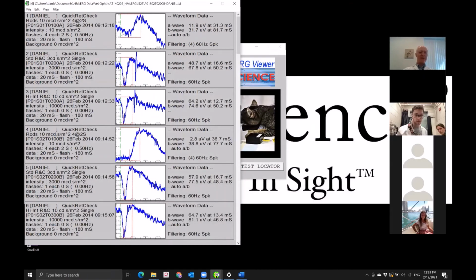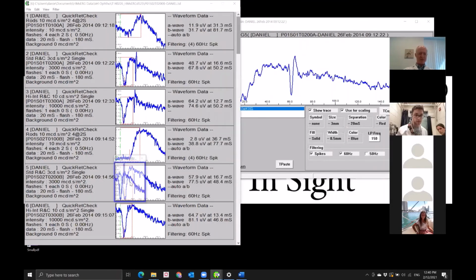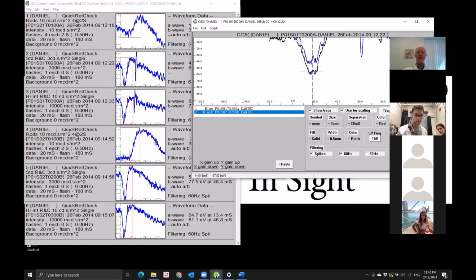So now we have a bit more relevant data to compare. So let's see what type of change happened over time between the A channel here for the 3 candela and then later on. So I'll right click this, put a comparison graph together, set up, move over a little bit, and then throw in this comparative graph and then overlay them. So you can see that they're fairly close in morphology, but that second flash a couple minutes later yielded a little stronger A-wave effect.